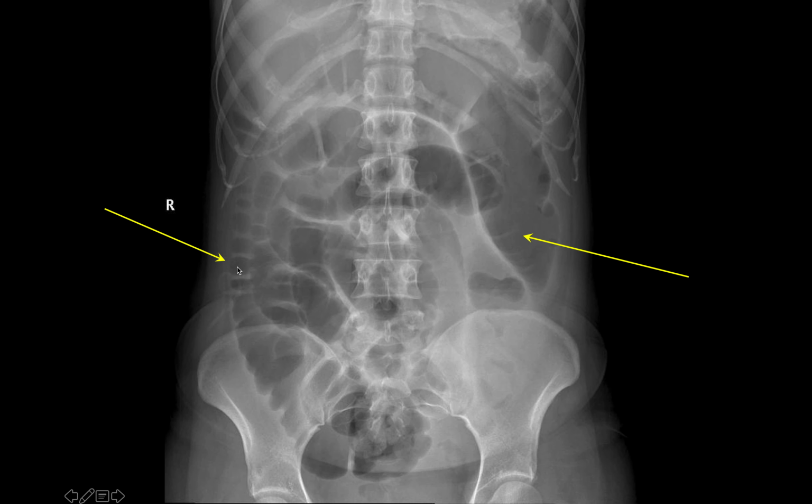And now in this one, hopefully you can make out the large intestine quite well. You can see the haustra or the saculations, and then down here you can also note where there's a large bowel obstruction, so you get this dilation or distension of the large intestine, and then it disappears distal to that location.